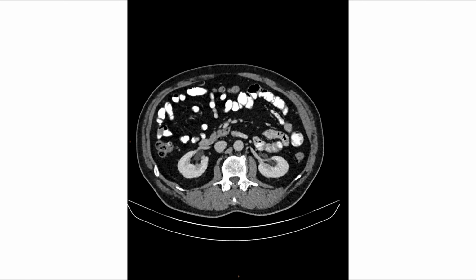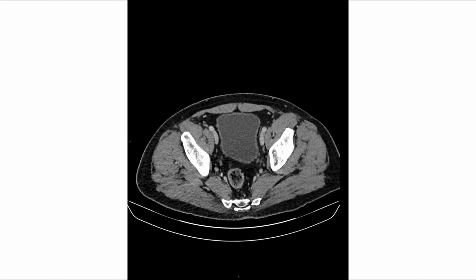Similarly, in the axial view, we can visualize the ureter having two lumina instead of one single lumen, and being positioned, in this case, anterior to the renal vasculature, which again is an anatomic variation. Usually ureters are posterior to the abdominal vessels. And then moving even more inferiorly, closer to the interface of the ureter and the urinary bladder, as I mentioned, the ureters are retroperitoneal structures and they approach the bladder from the superior posterior aspect. Here we can visualize two dots that represent the patient's right bifid ureter.